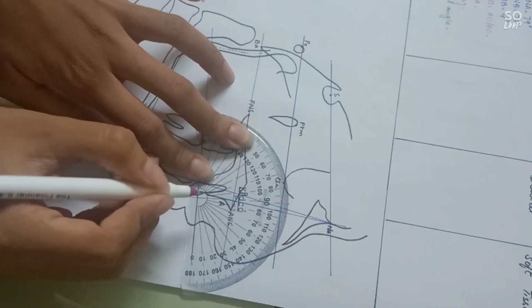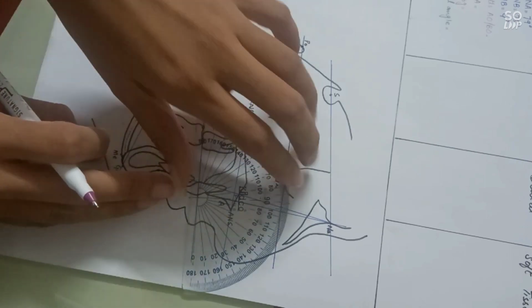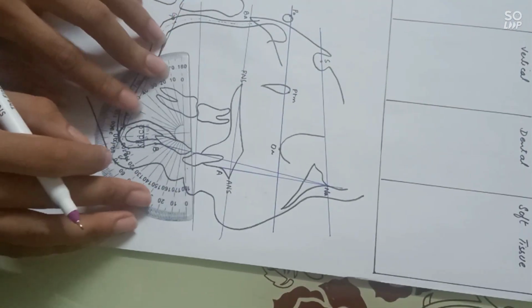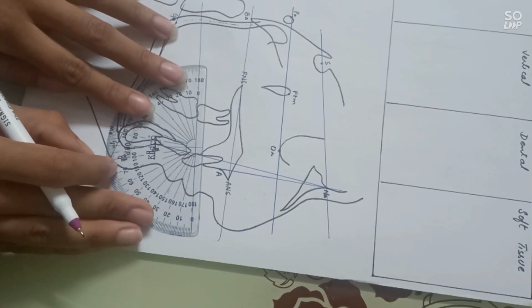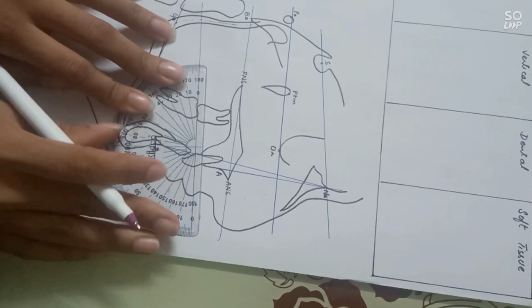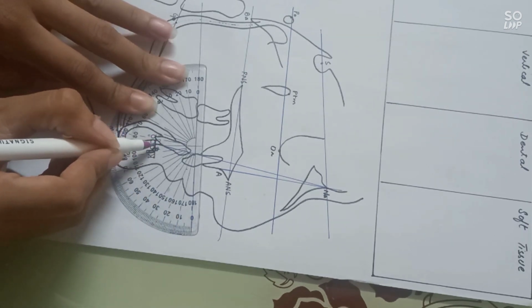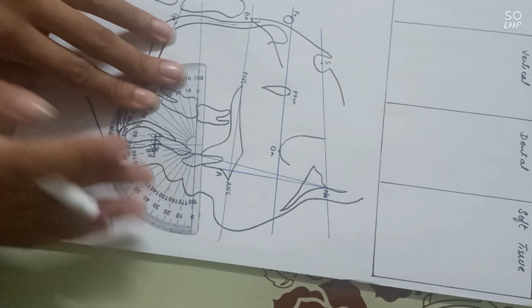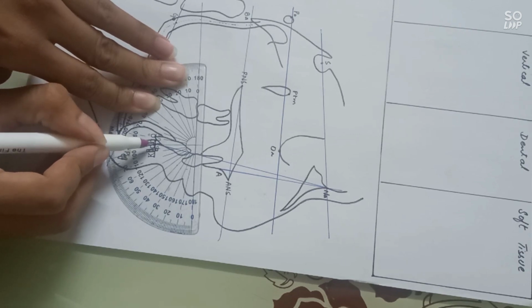Make a point above and below the D. Later on we will merge these 2 points. Now for BO, use the same technique. Now your 90 degree point is this. It is a bit forward now, moving it backward. This is your 90 degree line coinciding with point B.